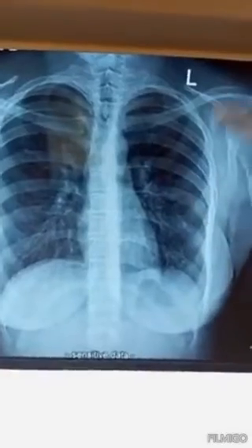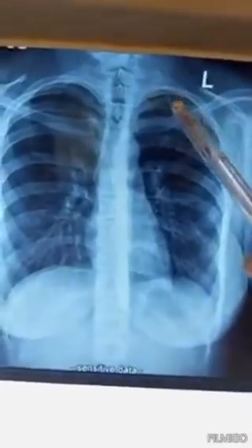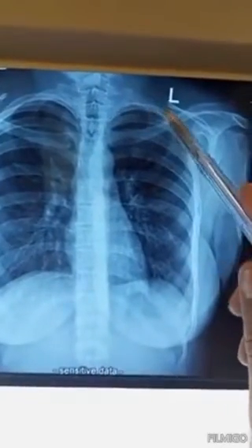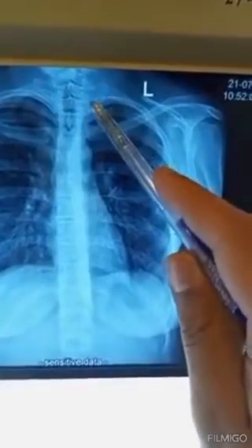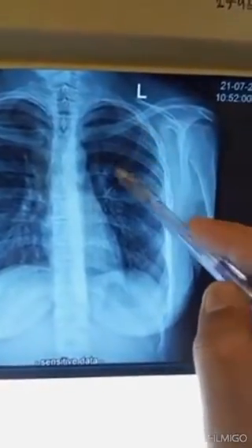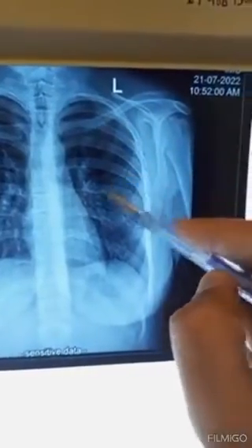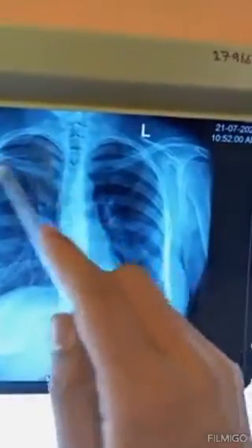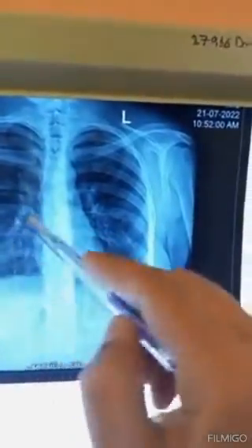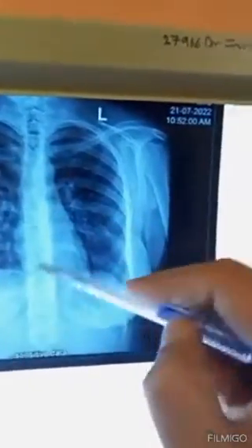And then comment on everything else. Comment on this rib, trace this rib to the posterior. This is the posterior segment, and then coming into the anterior. This is the second rib posteriorly coming into the anterior. This third, this fourth. Then count these ribs, and these ribs are also looking normal, right? Then look at the vertebrae, these are also looking normal.